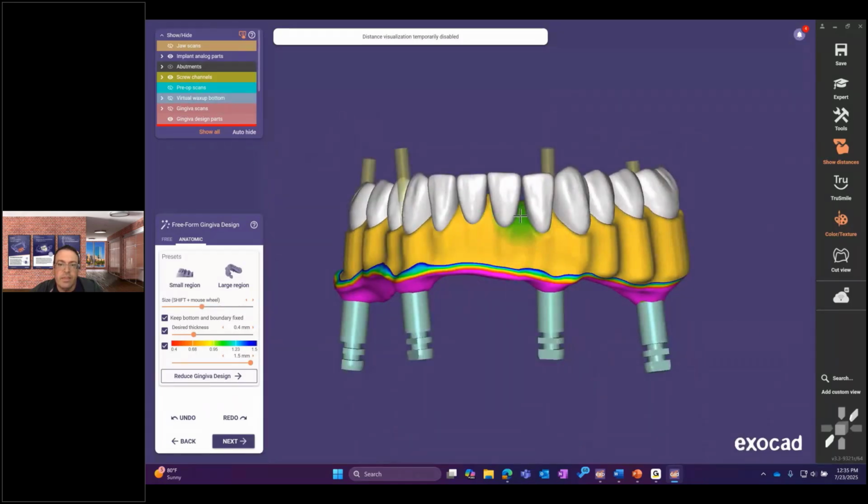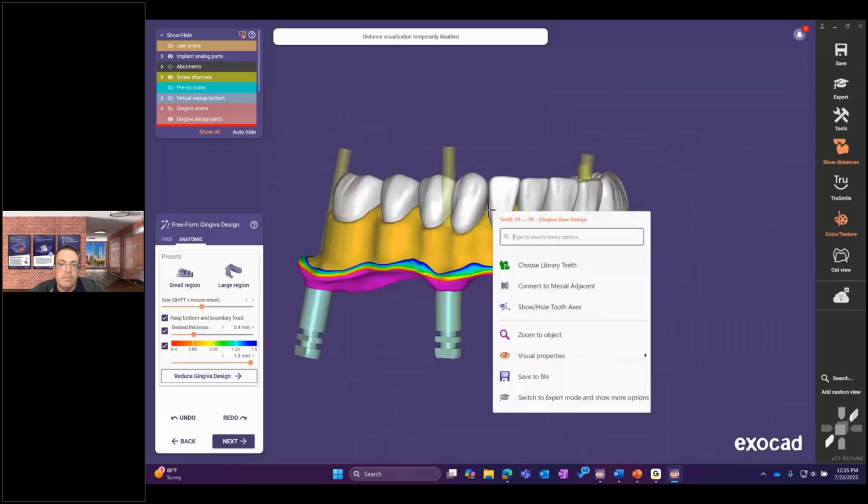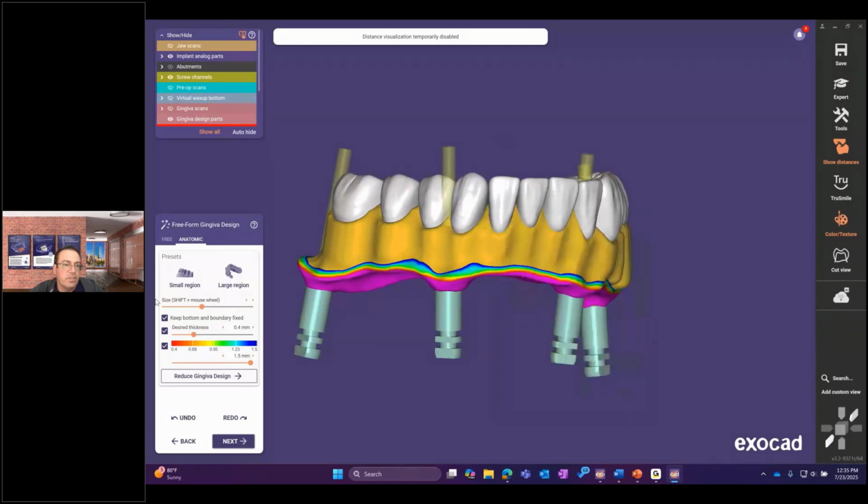So that's really useful. You're not fixed to just those two selections here. If you click those buttons, you can see those correspond to some presets on that size scale now. So even the large region, you can expand to quite a lot bigger, depending on what you're trying to adjust here.